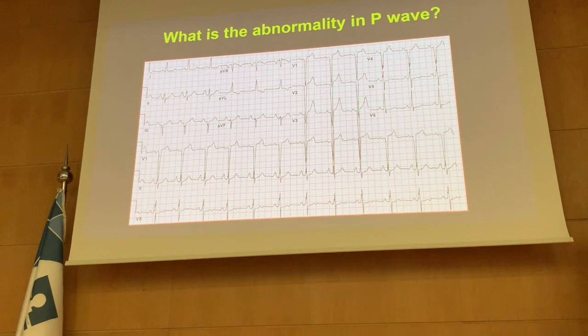So we are really interested now to see the atria. Okay, so in lead one, there is something here, we don't know what is this, and there is a wave here. And Nurhan said, this is the QRS, and this is something extra. Is she wrong or right? Wrong. Why? Okay, correct yourself. What is this and what is this? The second one is the P wave. This is P wave? No. This is P wave? Yes. This is big P wave.